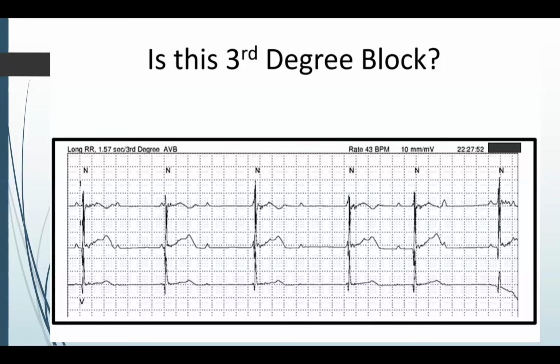But this is an important distinction, particularly if this were a post-op patient who had third degree and then started doing this. It might be a good sign that something positive is coming. Certainly, if I saw this on post-op day 4, for example, I would be marginally more optimistic that there is at least some conduction trying to come through. All right. Any questions about that? Okay. All right.